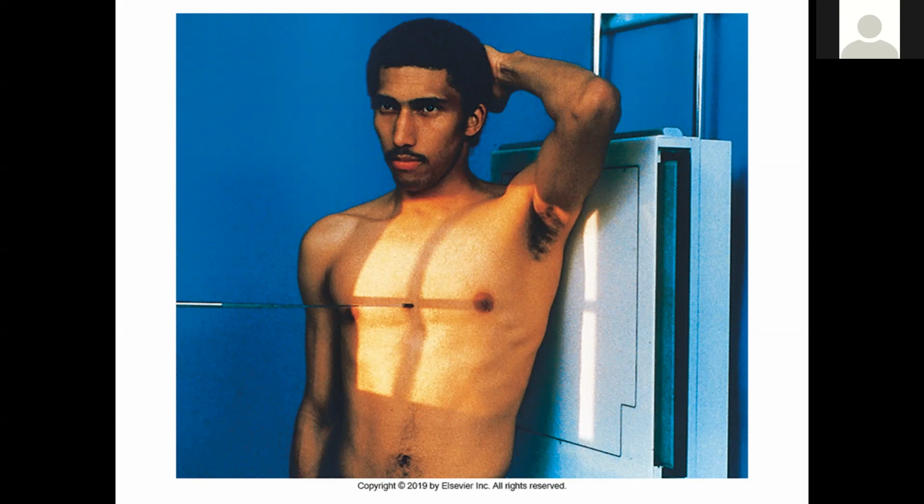In this case, we're looking at an AP oblique rib, and the patient is left posterior oblique. So this patient is LPO. That is going to elongate the left side ribs and foreshorten the right side ribs. If your patient were rolled the opposite direction, an RPO position, the right side would be elongated and the left would be foreshortened.